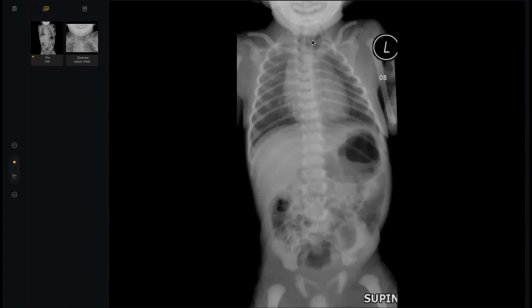I think not associated with a fistula. From where did this air come? Oh, from where? So it is associated with a fistula. Okay. So this is esophageal atresia with fistula. So it is not type 1 or 5, because if it is 5, it should come down. It is between 2, 3, 4, at least. But I think it is not 2.